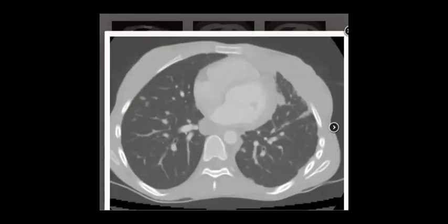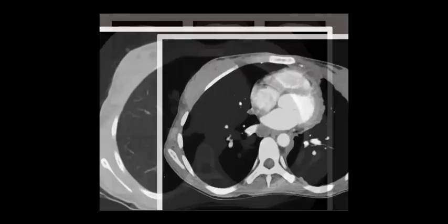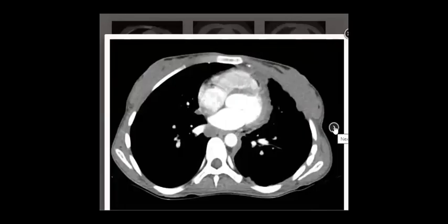And if you go to the mediastinal window, I think it was this one. What do you see here? How do you solve it?